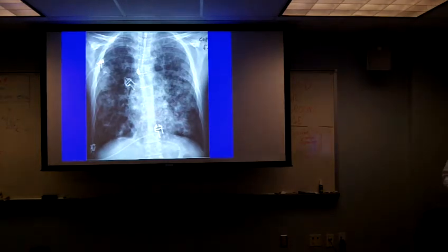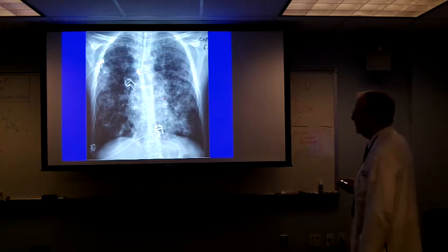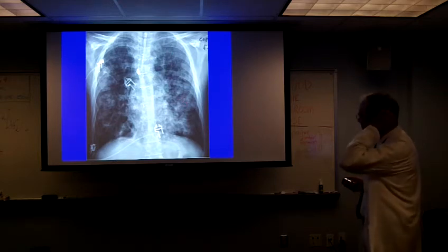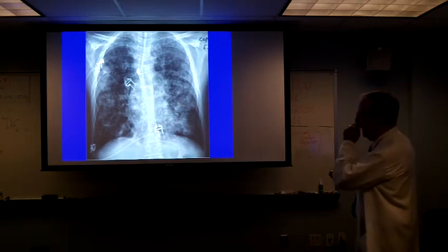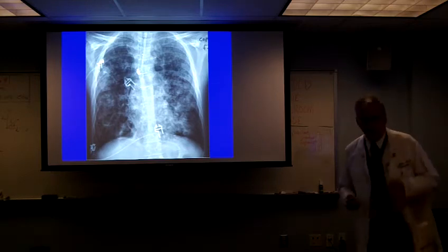This is a patient we saw a few years ago, and I can't remember just what all the underlying lung disease is. This may be resolving pulmonary contusion, but he had surgery, and I think it was for a traumatic rupture of the aorta. He's got a feeding tube in, and we saw this, and somebody raised the question of, could that be a tooth?